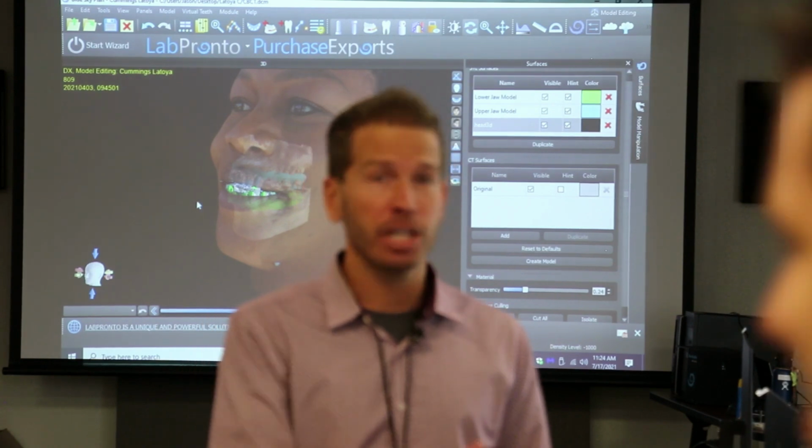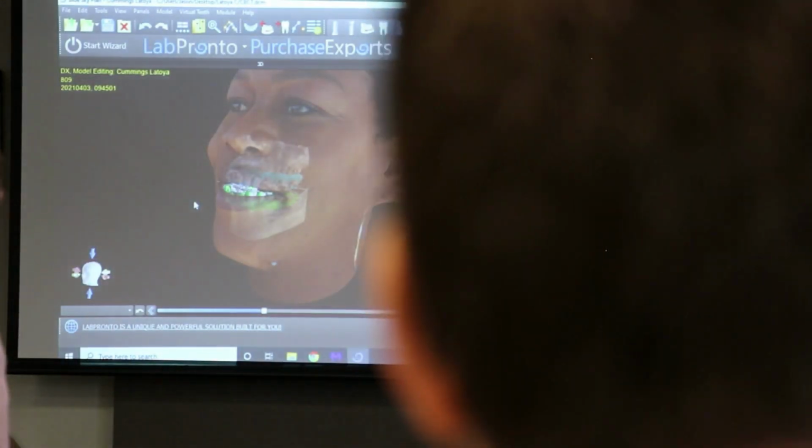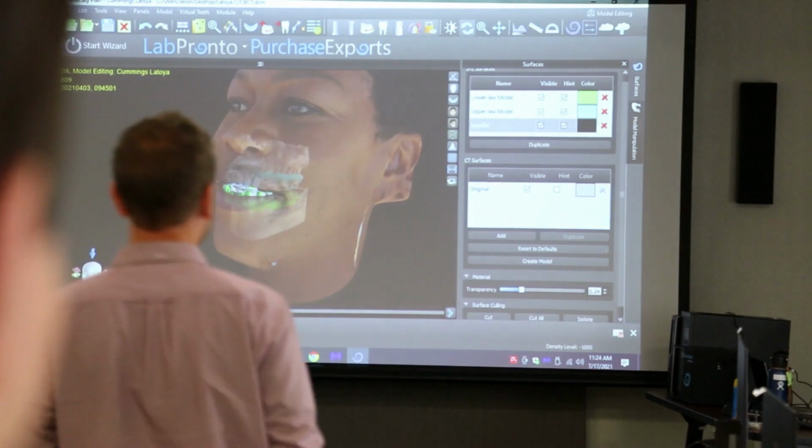And you can change the colors on those models to white, right? So you can change them all. It's perfect, man. You never have to worry about any of that.